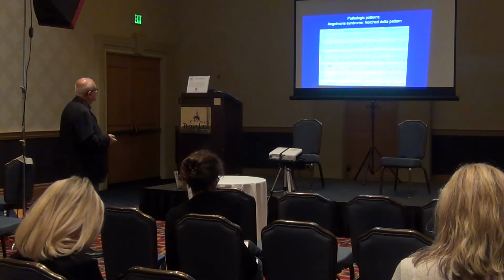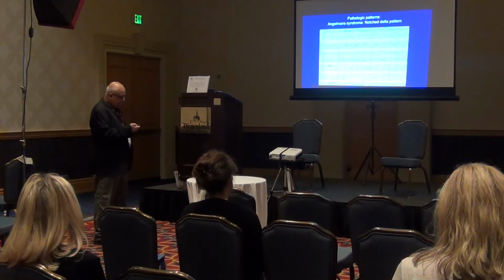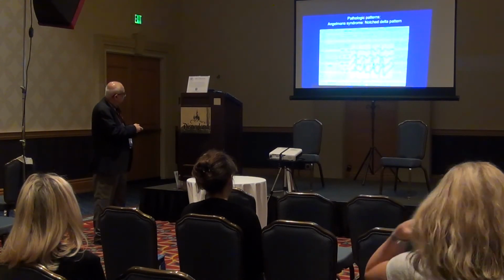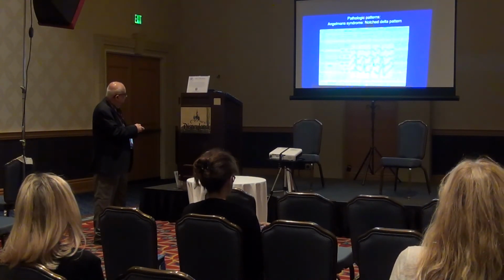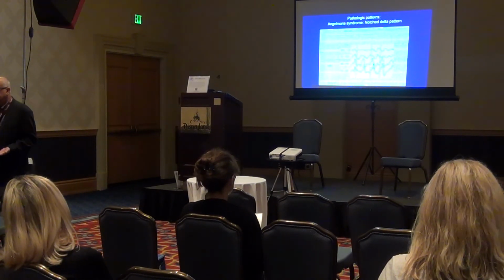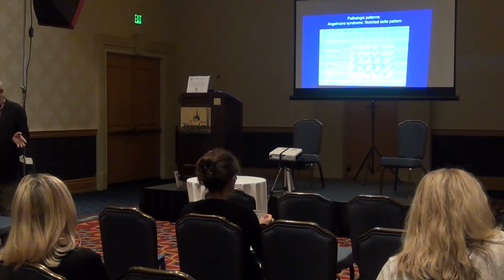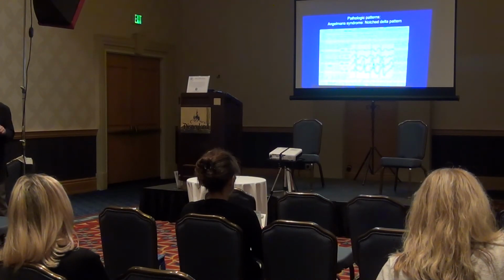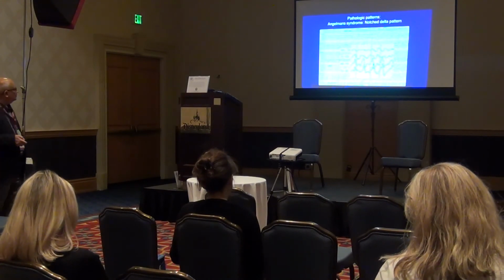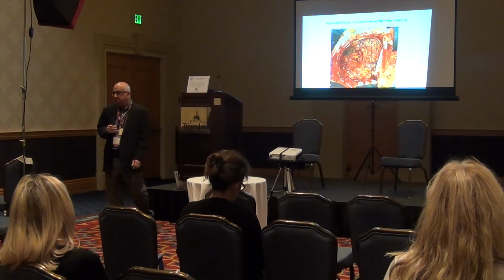And here we have Angelman syndrome. It's called notch delta, probably difficult to see in that magnification, but here you can see delta waves are slow, but see here the little notches. We tend to see that it's just a morphologic niceness in somebody with autistic spectrum and seizures and no language. We see this and say, that looks like Angelman. How do we confirm it? We confirm it with genetic testing.